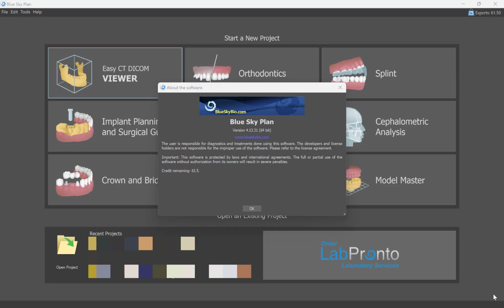Hey, this is Corey Glenn, and I'm going to do an updated video on how to make your first surgical guide in Blue Sky Plan, but this is going to be in the most recent version, which is 4.13.31. The reason I'm changing this, I've done a previous video, but there's been a whole lot of new features added to Blue Sky, and just thought I'd show some of those features. And hopefully, if you've never used Blue Sky Plan to make a surgical guide, this ought to get you on your way with just a routine, simple case.